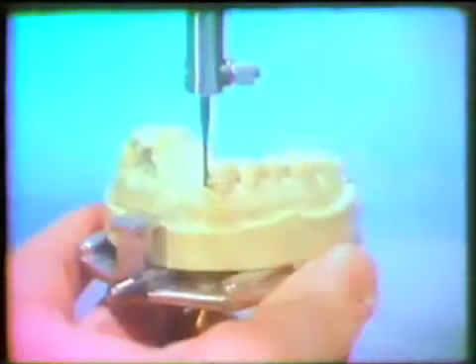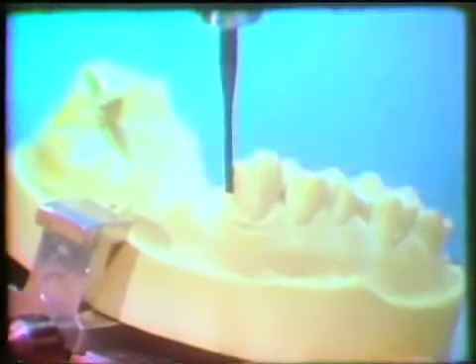After this has been accomplished, the surveying table is again moved so that the analyzing rod is in contact with the mesial surface of the cuspid as before. The cast is tilted until no more space exists between the analyzing rod and the mesial surface of the cuspid. The analyzing rod is then used to determine whether the rest of the partial denture will be able to seat in the rest preparation without interference. The same procedure is carried out on the opposite cuspid. It is apparent on this cast that no interference will exist.